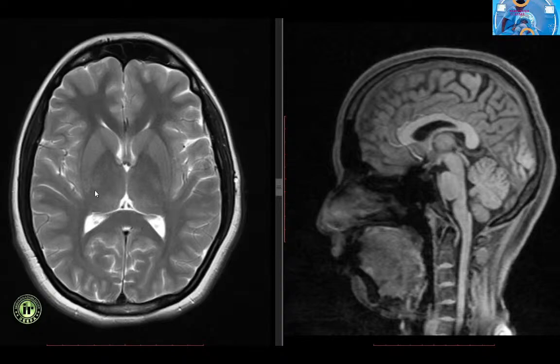On axial section, it appears V-shaped with the genu pointing medially, separating the anterior and the posterior limbs. The corticobulbar fibers are present in the genu and the corticospinal fibers are present in the posterior limb. These corticospinal fibers have relatively low myelin density and may appear as rounded foci of high signal intensity on T2 weighted images.